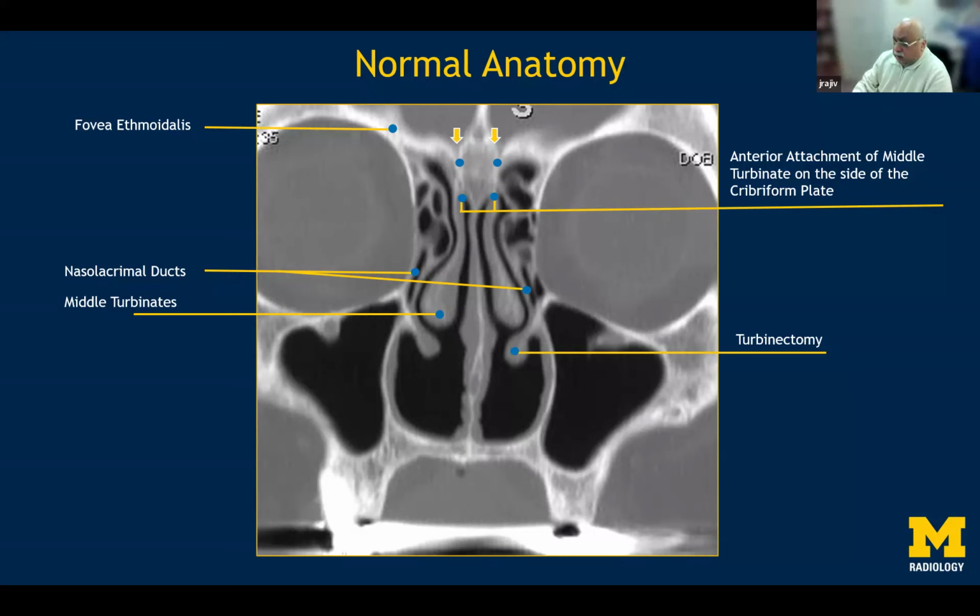In this particular instance, we can also see that the inferior turbinates have been resected and they appear to be blunted. But normally with the mucosa, they will appear as large globular structures, which are in the inferior portions of the nasal cavities.